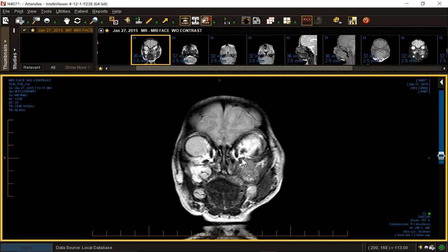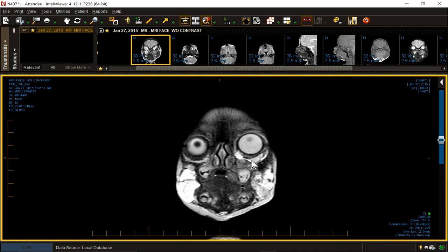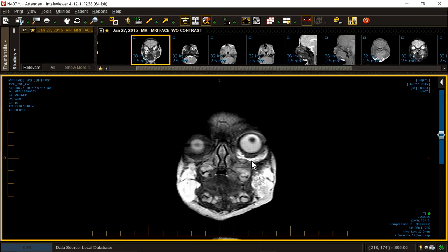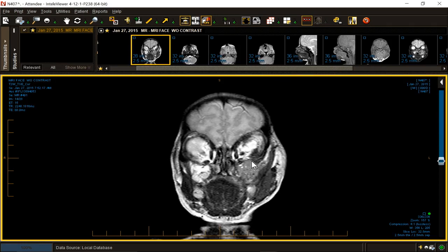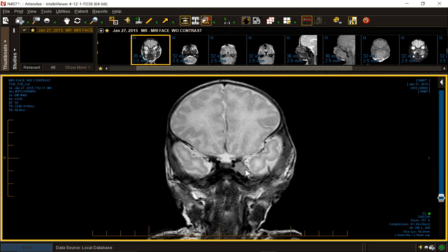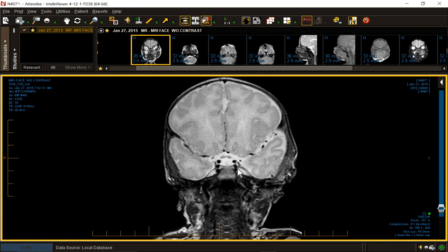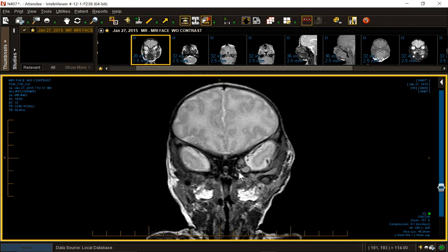It is pushing up on the inferior aspect of the orbit, but it is not arising from it. And we were able to make this diagnosis pretty quickly by following the mass. Let's follow it. Keep following it. It's now in Meckel's cave, isn't it? Let's go forward from Meckel's cave. What is that?